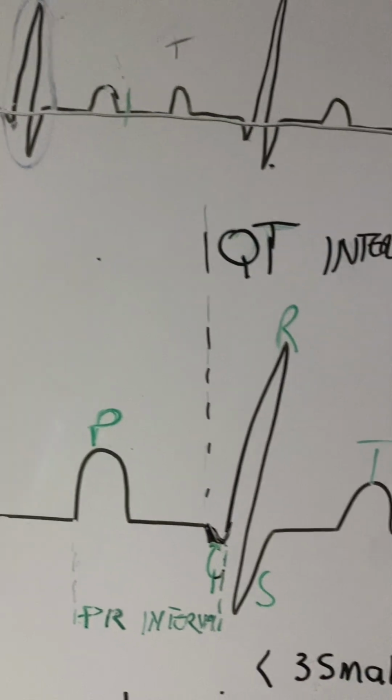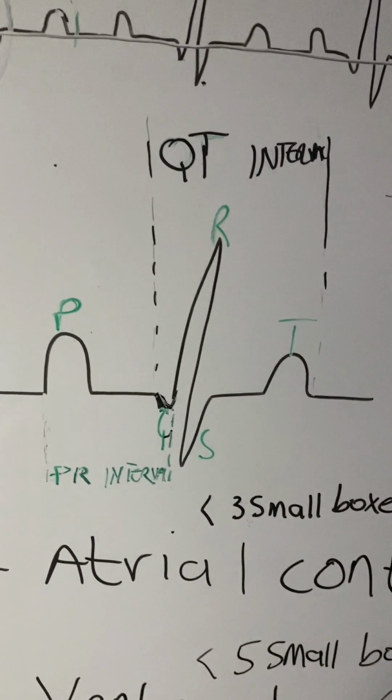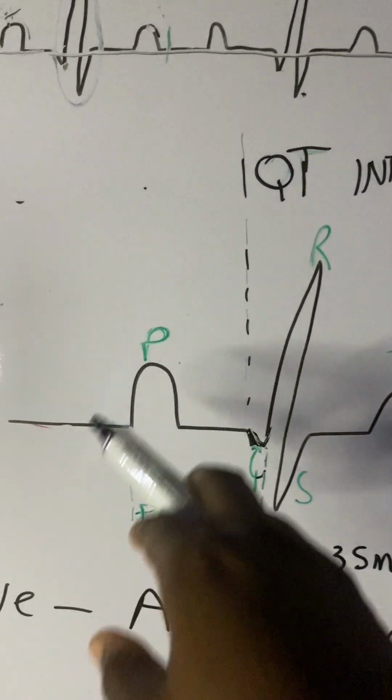Now let us look at the rhythm in details. Imagine this is our rhythm.